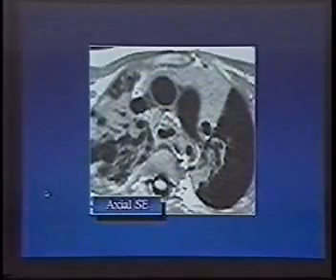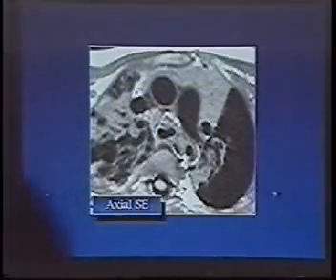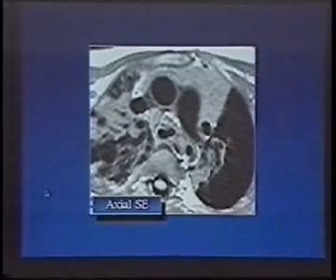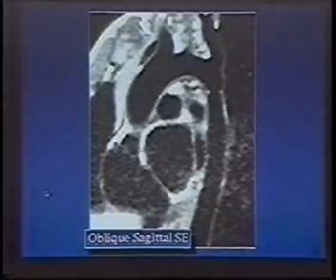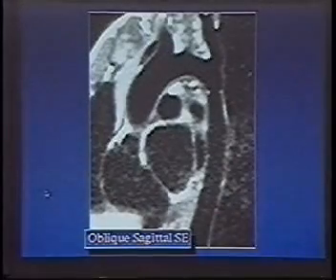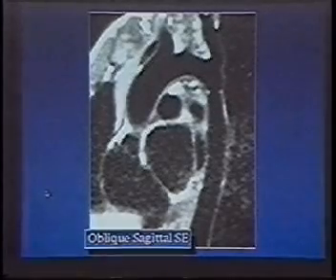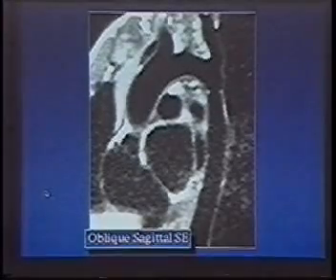So what do we do for coarctation of the aorta? Start out with axial images like this. This is the ascending aorta. The distal arch is markedly narrowed. We do these oblique sagittal images in that plane. We open up the aorta like this. We see the ascending aorta, the arch, and the descending aorta. And here, this is a moderately severe, discrete juxtaductal coarctation.